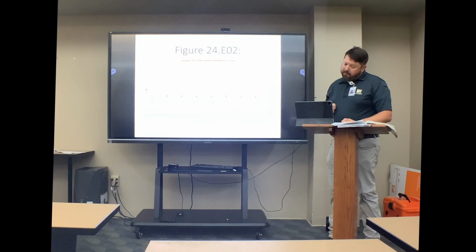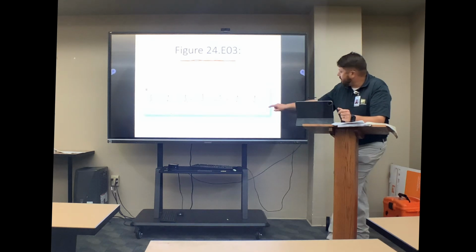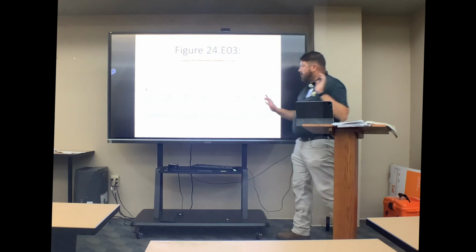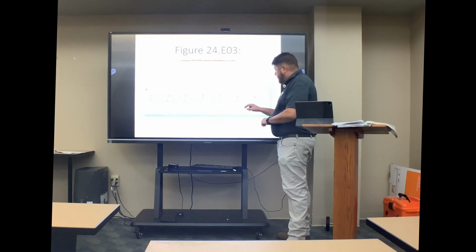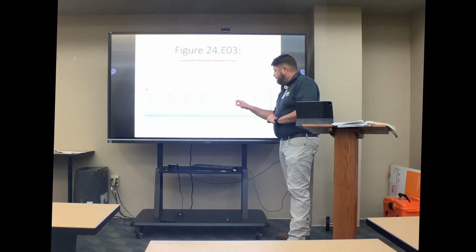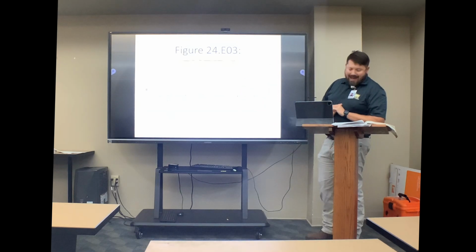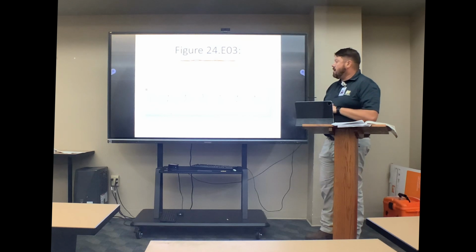Rate of 80, no P waves. So accelerated junctional. That's a Q wave. That's a Q right there. And one of the reasons why I know that is because there's really no, it just goes straight into the R. All right.